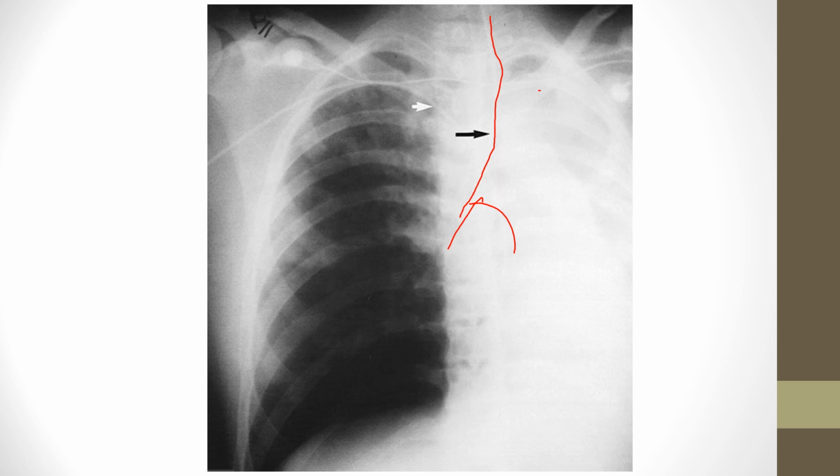Obviously this ET tube is mainstemmed, right? And so you're looking at this CVP line, is one of the things that you can see here, because the atelectasis is just so strong. It's having an issue with the lines as well, so it's a pretty significant issue over here, so they definitely need to pull back on that ET tube quite a bit.